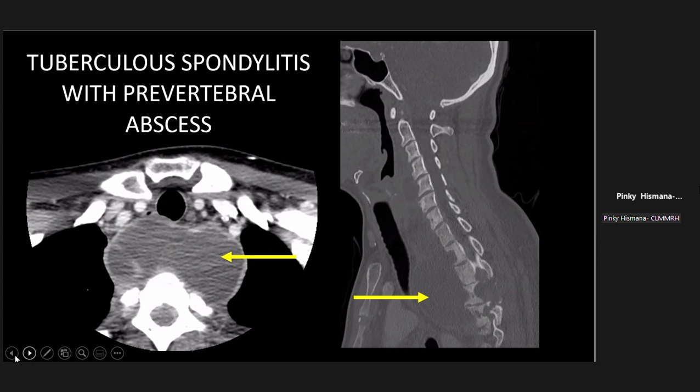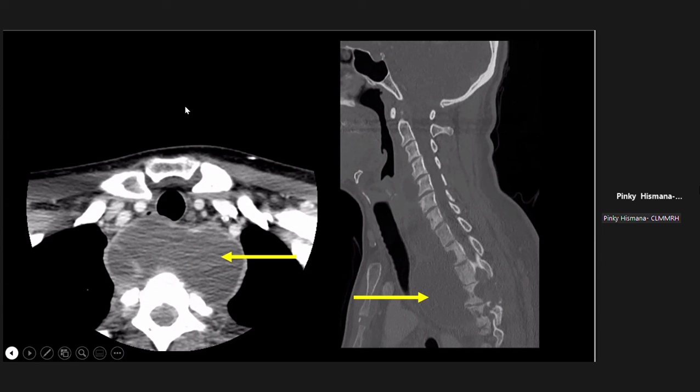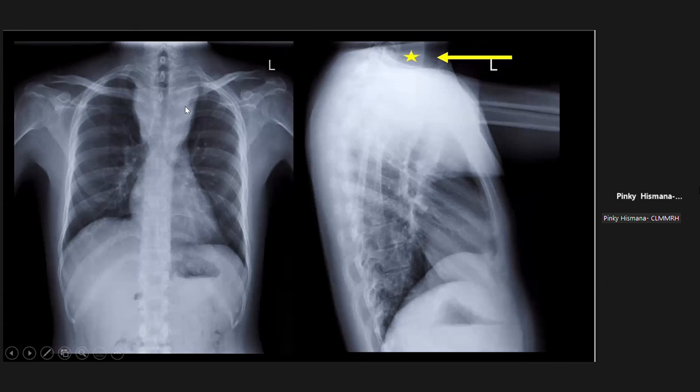So what I'm just trying to point out here is that though this appears to be at the sides of your trachea, this lesion actually is behind your trachea or posterior to your trachea. This is the problem actually with an X-ray wherein there's superimposition of the structures. It's really quite difficult for us.